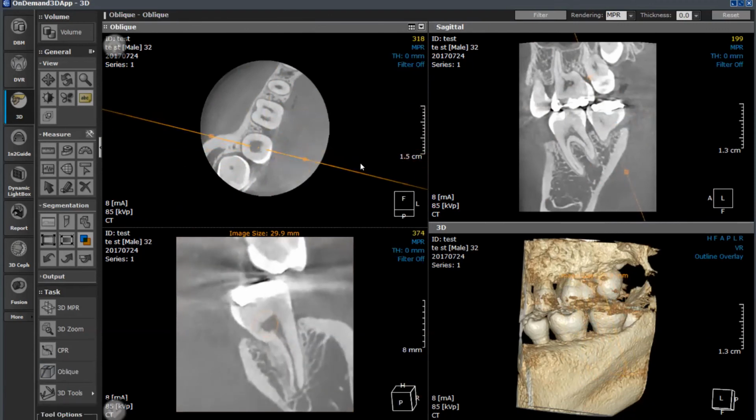Now, a lot of these images are not with our new MAR. We have a precision MAR that helps to reduce some of the metals. So you can see here that even with these fillings, you're getting a little refraction, that with our precision MAR, we actually get a much clearer view now. And you can actually evaluate right next to things like braces and implants, because you don't get that shadowing any further.